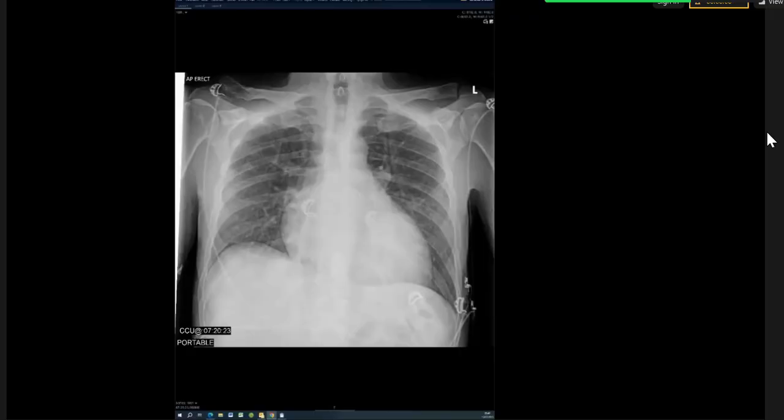Please tell me how to differentiate interstitial lung disease from pneumonia. That's probably a lecture rather than a two-sentence answer. But the simple answer is consolidation. You want to see haziness on a bigger scale, and consolidation, to call something pneumonia. Interstitial lung disease needs to give you a reticulation with lower lung volumes.